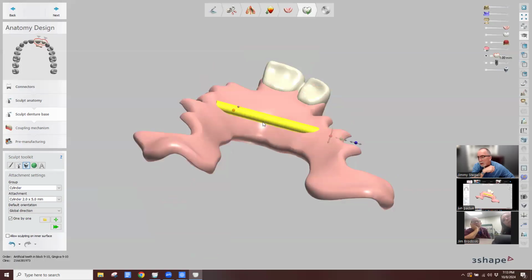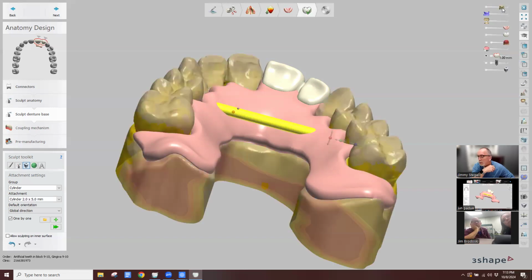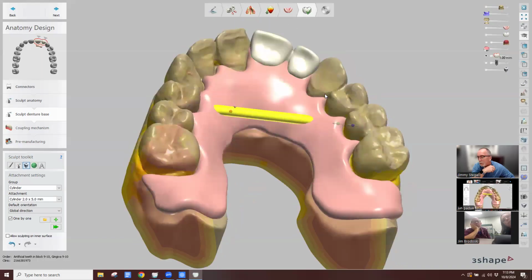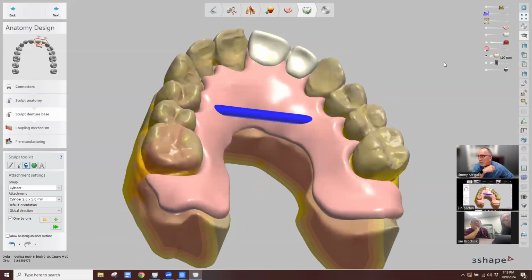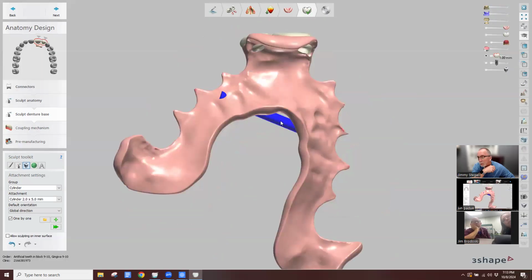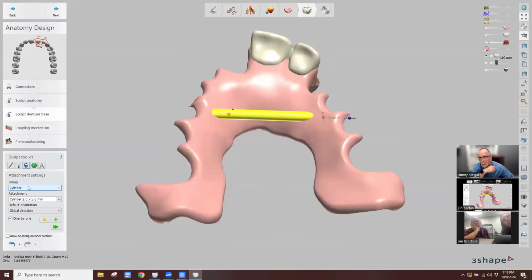It's still following the same principles for the most part. Top 5 mm away from the tooth pockets or from the margin, touching both sides, making sure it's not poking through clearly. And applying it. And then I would do that again in the back somewhere.